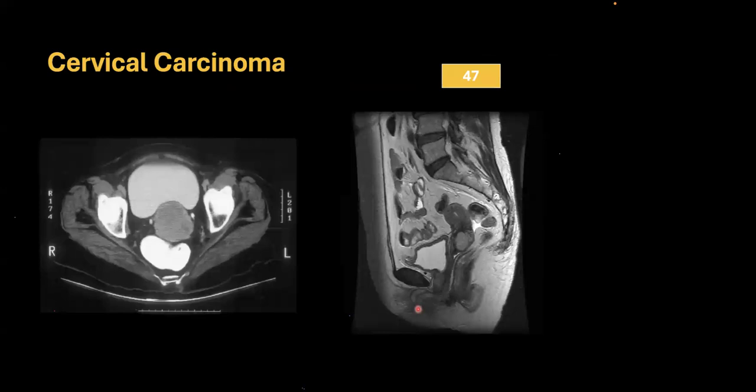So this is carcinoma cervix. Although it is a bit well defined for a carcinoma, somebody also called it a cervical fibroid. So I agree with it. This could have been a cervical fibroid also because it is quite well defined. But again, it is not cystic. Why would you call it that? Is it looking cystic? It is solid. It can't be an infected Nabothian cyst.